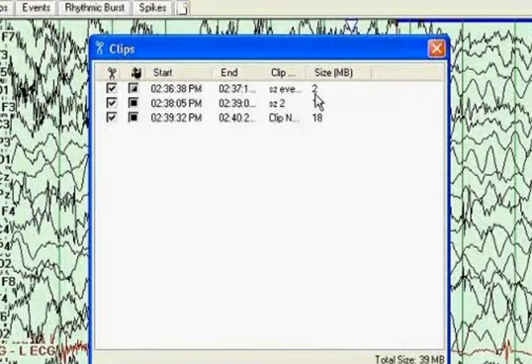You'll notice the corresponding change in our file size. If I left click on this again, it will remove video completely from the clip. So there are 3 toggle points. Left click once, you get a solid square, and you will get your full video quality. If I left click on it again, you get the half shade, which compresses it and reduces our file size to 2. And if you left click on it again, it removes video altogether from your clip.